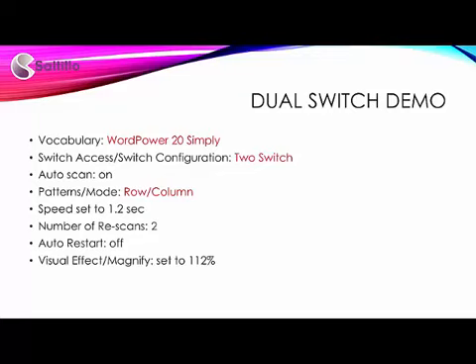This demo will use WordPower 20 simply with two switches in a row-column pattern. I can use a switch to wake up the device, or on the Chat Fusion I can touch the screen to wake it up.